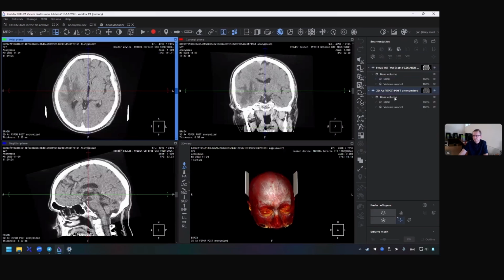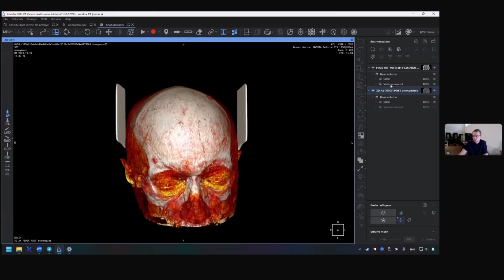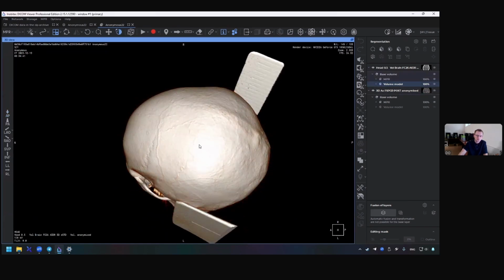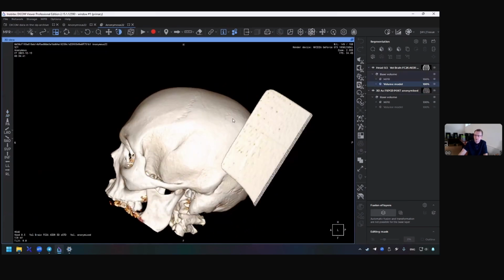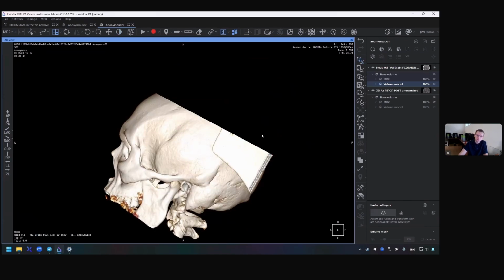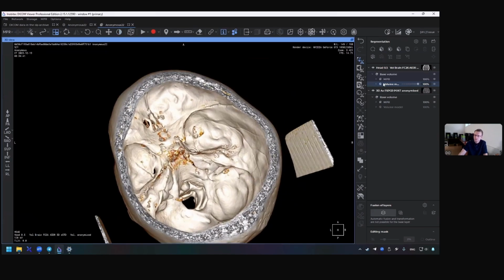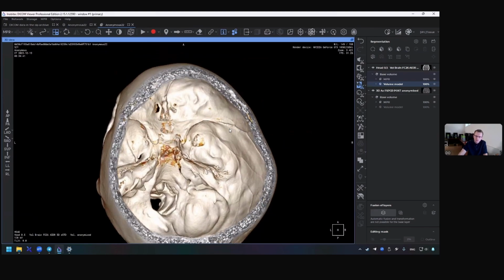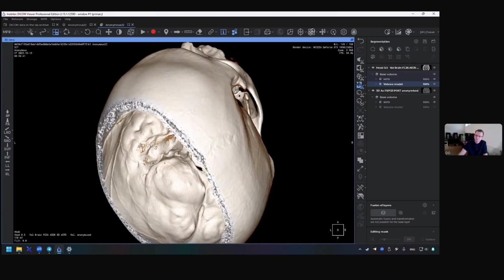For bone reconstruction, I suggest using the volume model. Let's tune it a little. We level and crop the voxel cloud. Maybe we need to cut all voxels except this object, for example, for better performance.